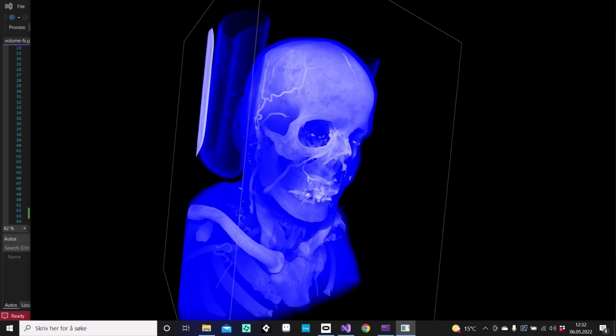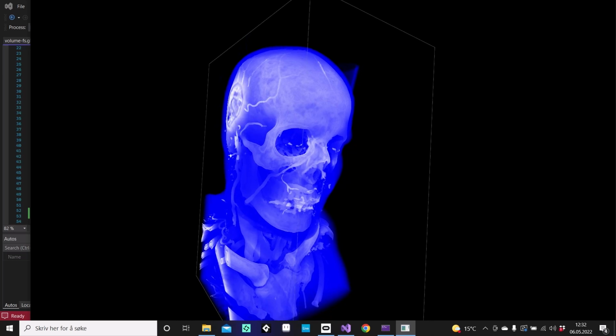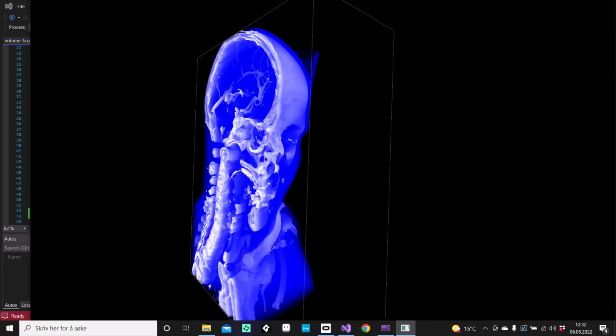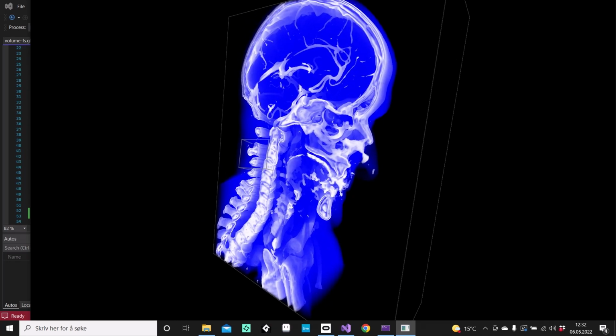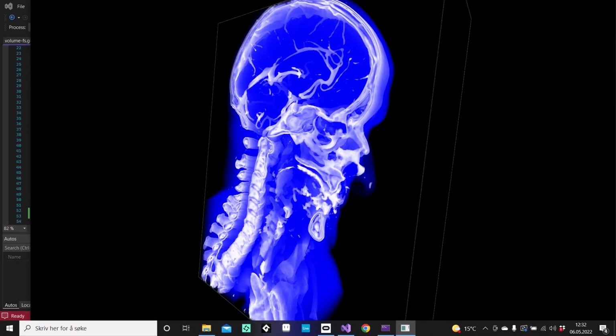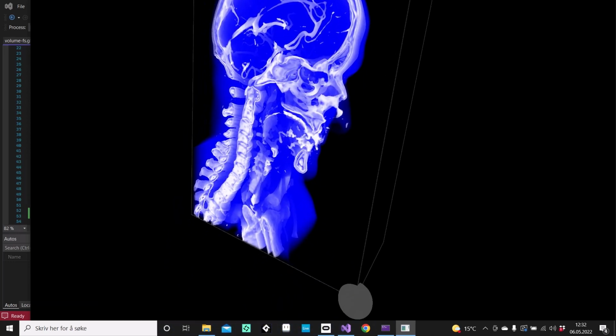The rendering method is based on a simplified emission absorption method and constructs a model consisting of two materials: an opaque white material defining the data values of interest and a semi-transparent colored material defining the rest.